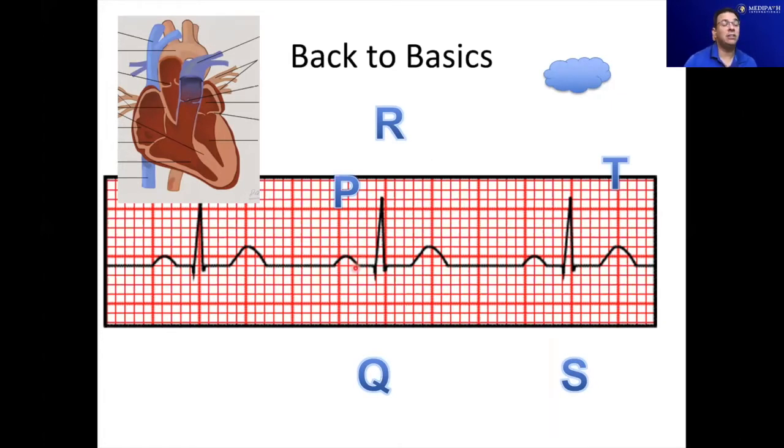That is the electrical activity of the atrium, followed by the QRS complex, which is the first deflection after the P wave. A Q wave actually doesn't occur in most of the leads. So oftentimes the first deflection is upwards, which would be the R wave. And then the second downward deflection would be the S wave, which would be here, but just to make it easier, I moved it over here. And then the T wave is the last deflection. The QRS complex is the depolarization of the ventricles, and the T wave is actually when the ventricles are repolarized.